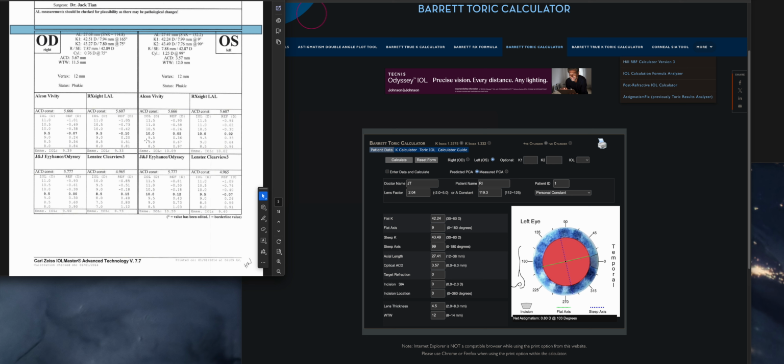It's going to be off by like a diopter, maybe a half diopter here. We're looking at the Johnson & Johnson lenses. I think it was 10 and 10.5 were the two lenses, so you can see consistently, a little off. Not by much this time, but again, there are going to be differences in the formulas, and we want to use the most up-to-date ones.